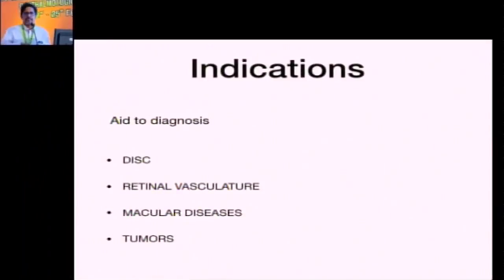So this will be a short presentation. I will not be going into the basics and principles. We will be just looking at a few case examples to give an idea of where all we can apply this investigation in making a diagnosis or deciding on the modality of treatment.